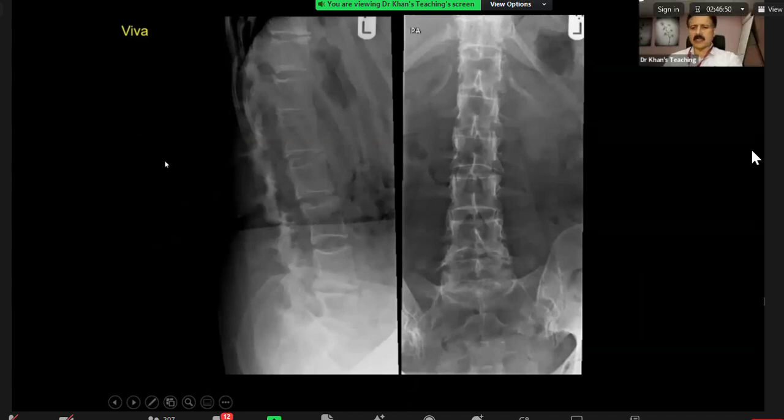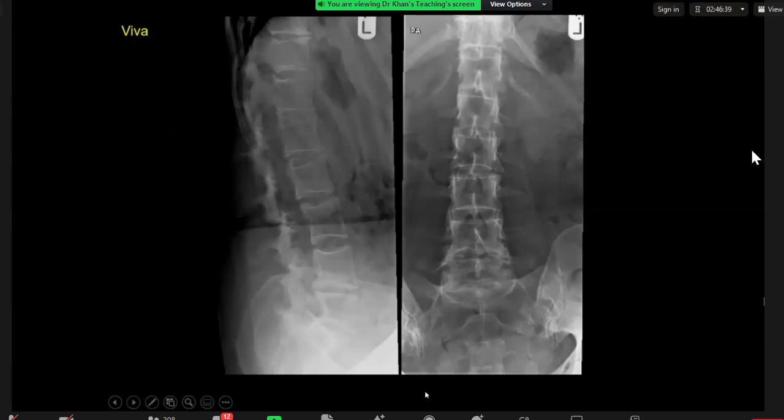This is a repetition. I've shown you this case previously also, but it's a revision case. So over to you, candidate one. I'm presented with frontal and lateral radiographs of the lumbar spine in an adult patient. On the lateral projection, I can see posterior scalloping of the vertebral bodies. There's also some destructive change to the lamina from level L2 to L5. Having a look at the frontal view, there appears to be some lateral displacement of the pedicles.